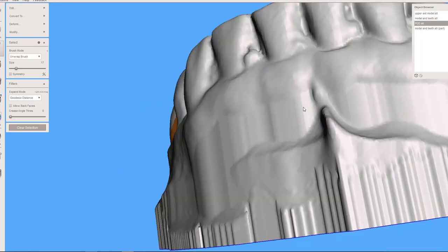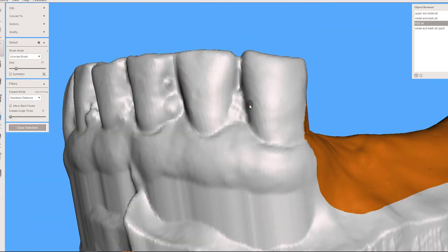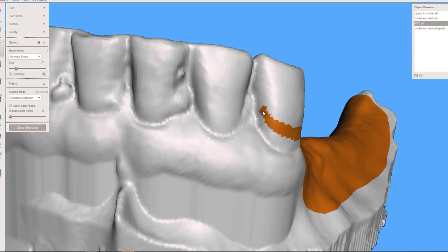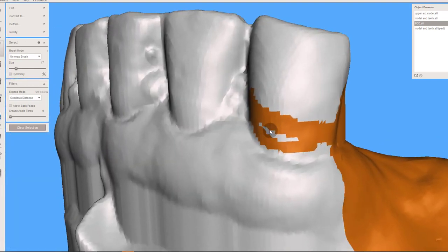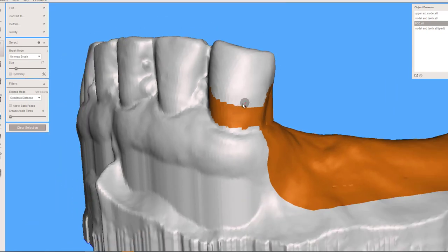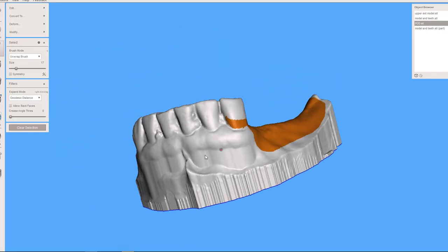And now I'm going to come around and do the same thing on this canine. So probably won't have that clasp reach into right there. Now aesthetically, this is not going to really show, so less important than maybe it would be on the maxillary. But I do want to keep those off the gingiva, because I find those flexible partial clasps, if they're on the gingiva, they just will eat the patient alive. They're really uncomfortable. All right, that's good enough for demo purposes, right?